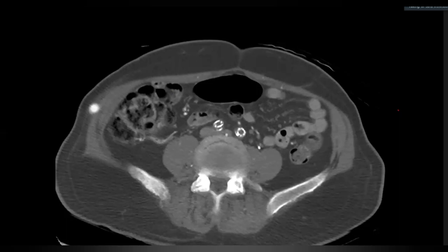Yes, sir. So I would correlate with the history of any previous intravascular procedure. Well, the patient had stents, right? So the stents are blocked. Yes, right, sir. If you called it stent, or if it's calcification versus stent, it's not important. These are occluded. The common iliac arteries are occluded bilaterally.